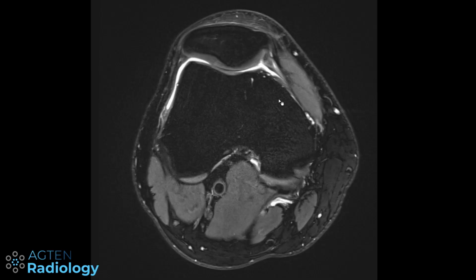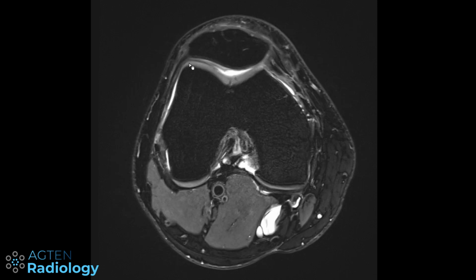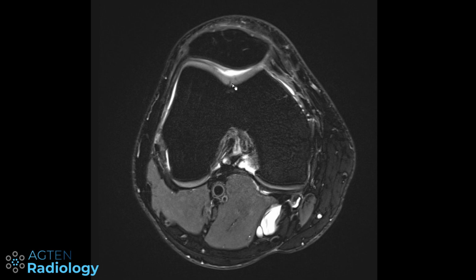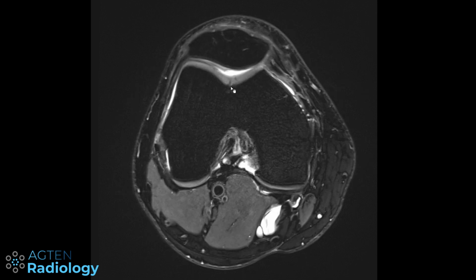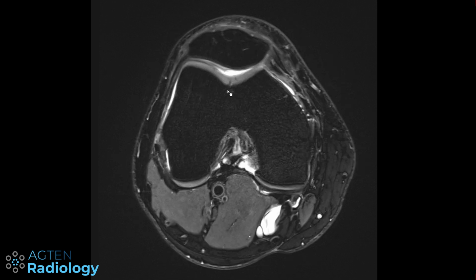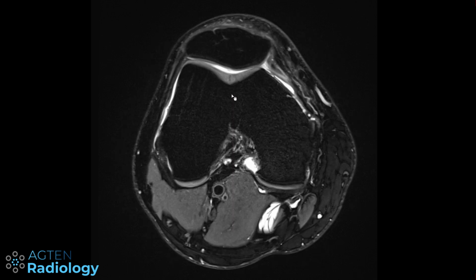So here's a typical case of a black line sign in the cartilage. Here we are at the level of the knee, transverse sections, and you can see here in the trochlea femoris, just here in the trough, that there is a black signal in the cartilage and it's perpendicular to the surface. So it's always running at this location in a vertical orientation, and you can see that we even have some subchondral changes here in the adjacent bone.